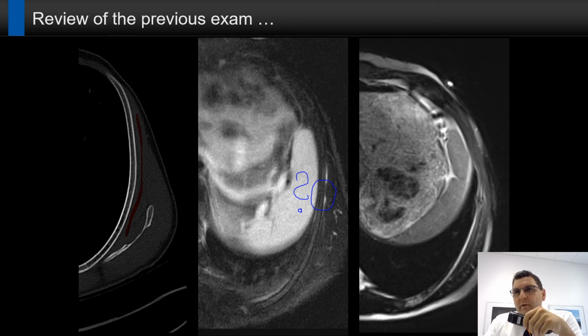You can see there is no signal intensity change in the rib at that day, and 12 days later we had the fracture here. So my conclusion was that rib fractures are very difficult to see, even if you know that they are there. I will be super careful in the future with rib fractures. Again, I did ultrasound, X-ray, CT and MRI. In this case, I was not able to see the rib fracture, and 12 days later there was a fracture.